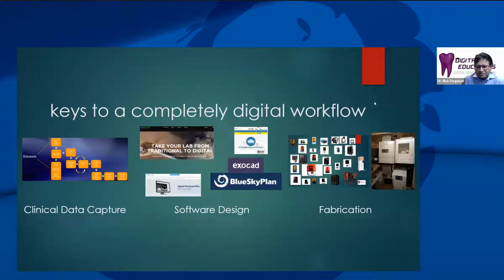To understand digital dentistry, we have to understand that it's a variety of procedures. We are clinically capturing data. We're doing software design, and then we're doing fabrication. Now, the fabrication part of it can be in the form of 3D printing today or milling. It's rare that we do anything manually today as far as fabrication. So the idea is that we now have software that makes this easy.